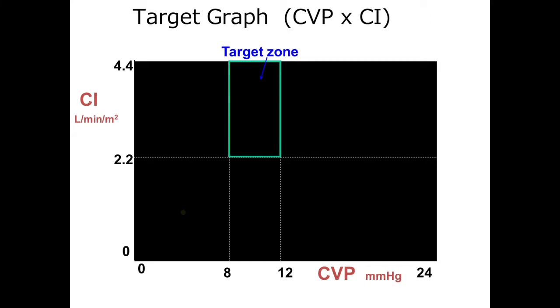It's flexible. The idea is, when we get the patient's vital signs, I'm not sure if you can see here, the patient condition is here, which means very low cardiac output and very low CVP, which means fluid is very low and the blood flow is very low. So the doctor can decide, okay, this patient needs fluid, so we can start a fluid challenge here.